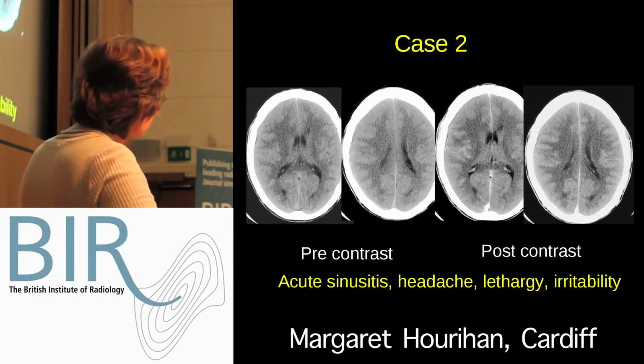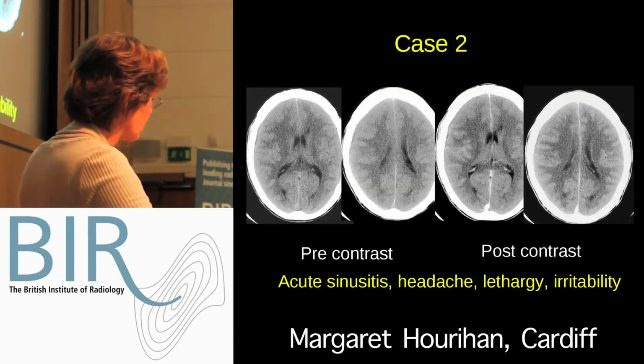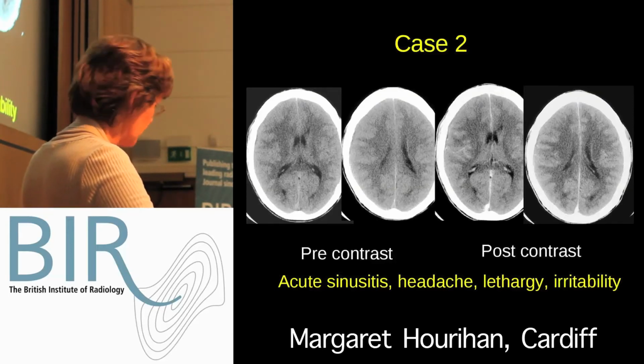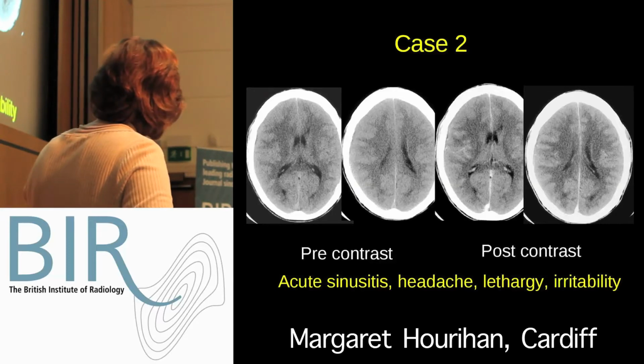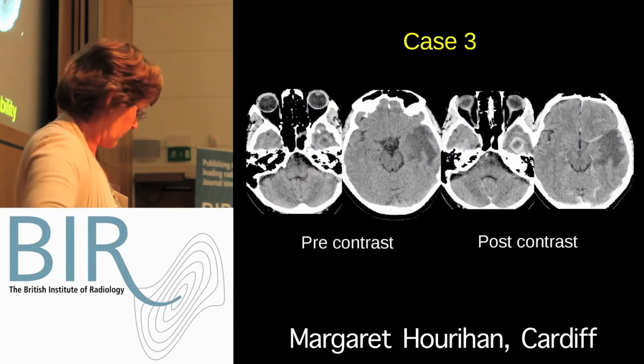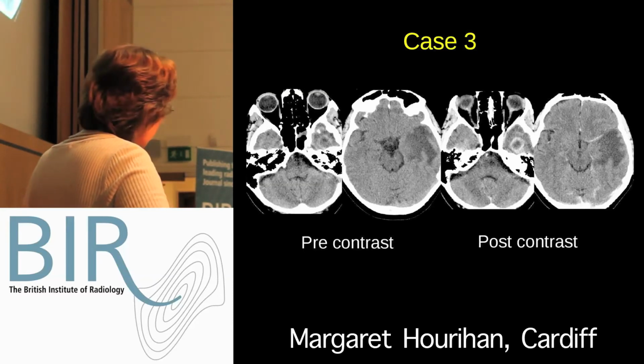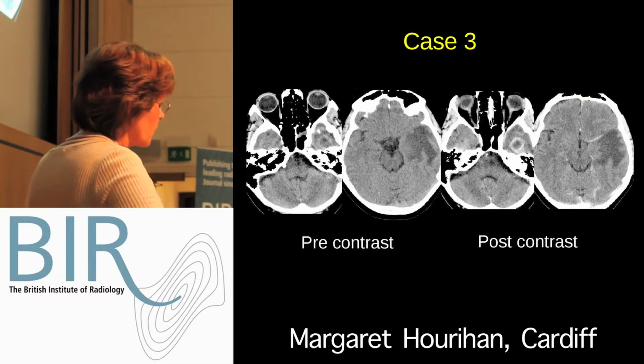Okay, this is your second case. Pre and post contrast in a patient with acute sinusitis, headache and lethargy. And your third case, pre and post contrast.